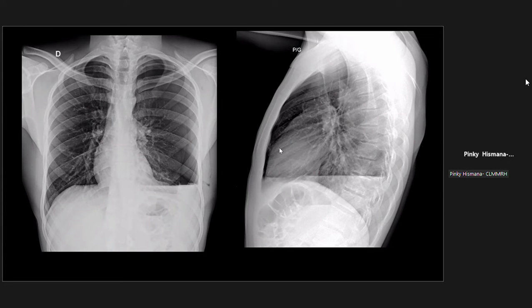Koki Sato? Can you see the right lung? Is there some sort of abnormality there, or do you think it's normal? I guess the right side is more opaque than the left side.